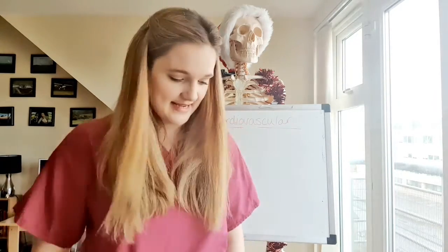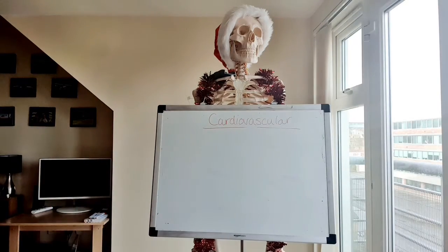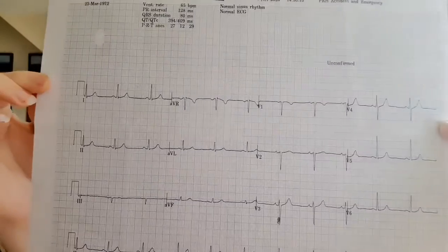I know it's not on my normal upload schedule, but I promised you guys a little bonus weekend ECG video, so that's what we're going to do today. So first thing I want to do is to show you an ECG, okay? This is what one looks like.